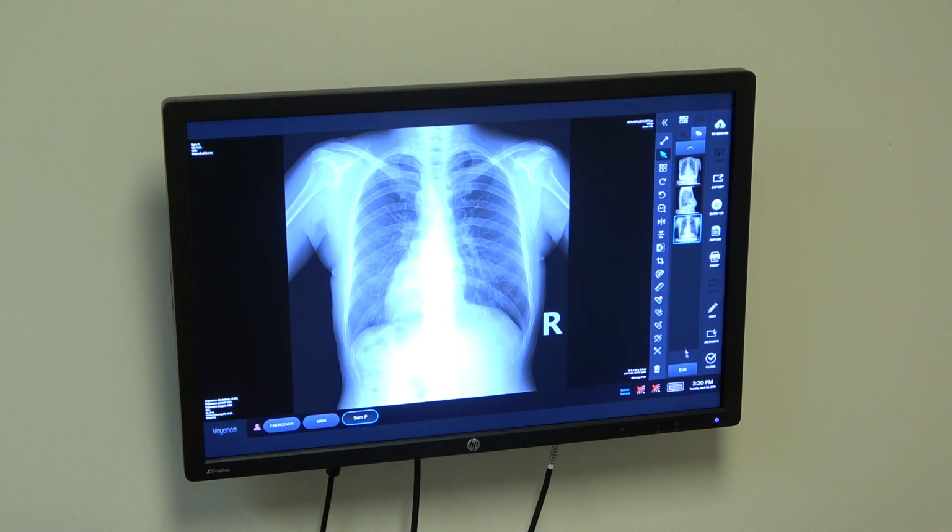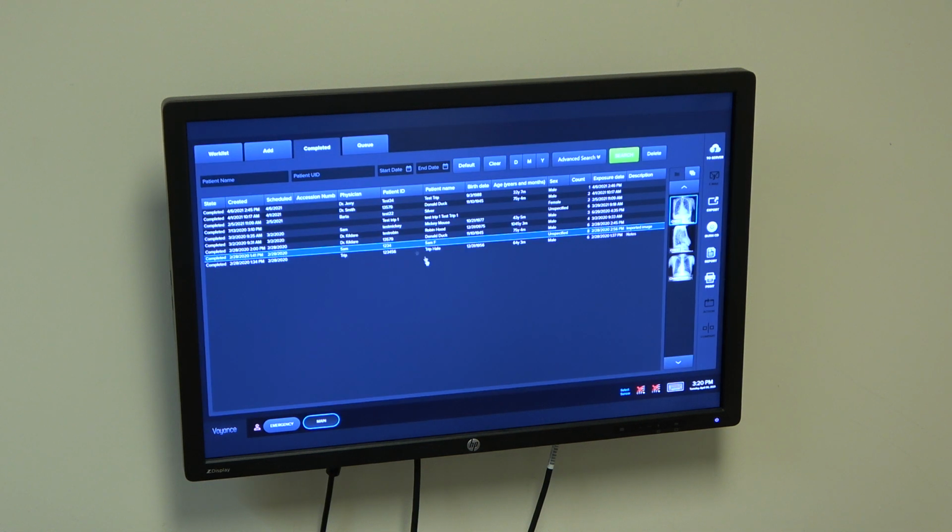So it's very nice for moving images, or if you want to take maybe a copy of a report or some pertinent article or anything like that and attach it to this patient's study, you would just simply import it in. You can actually go to the internet, bring in some type of document, save it on your desktop, and import it straight in. It's a very nice feature for it.